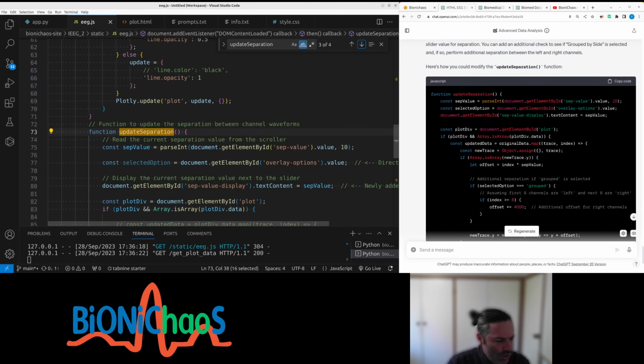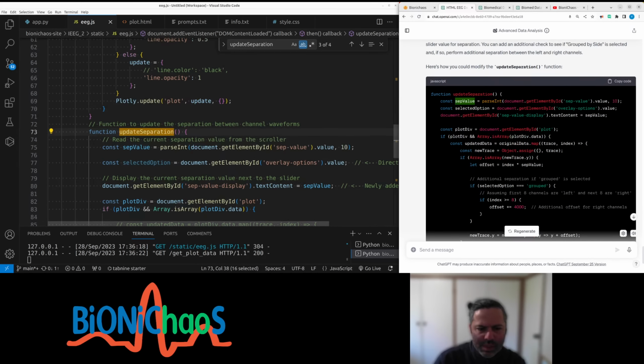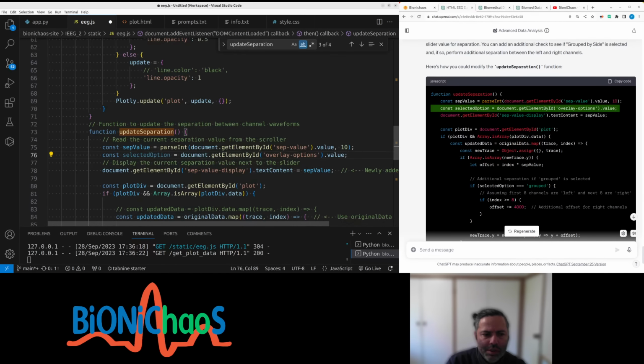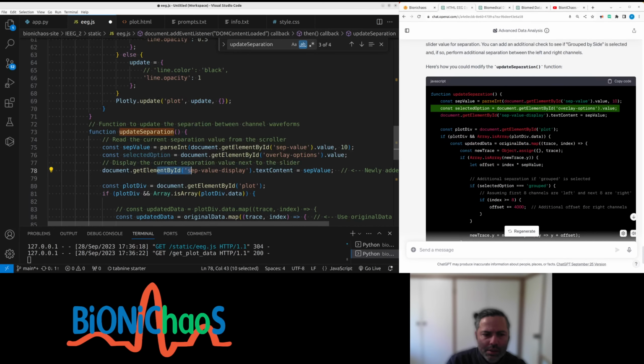Separation function. It's this one. This one is never being used. Why? The same.